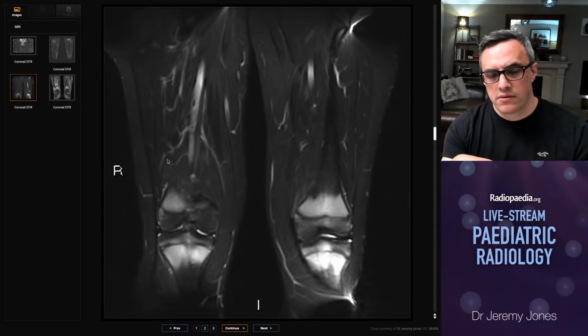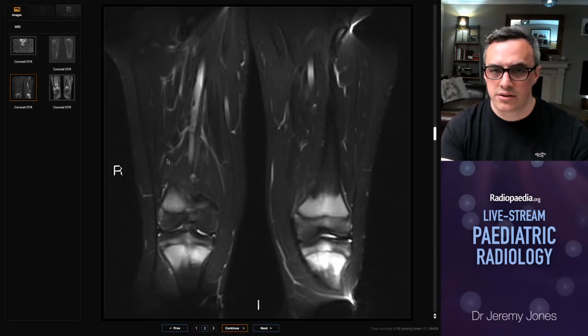So this is actually an inflammatory condition and presents with bilateral, often symmetric edema, often near the joints. There are some bones that get affected more than others. So acetabular roofs, nice place for CRMO to go. Medial clavicle, it loves the medial clavicle and nothing else does. So if you see medial clavicle, think CRMO. And where else? Spine. It loves the spine as well. So an older child with vertebra plana or bone marrow edema in a vertebral body, it's really worthwhile thinking about this as a differential.